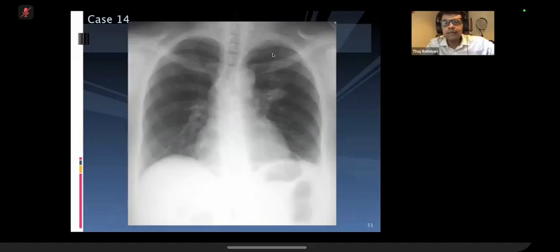So what has happened is that the vascular structures are sparse here in comparison to all the branching blood vessels on the right side. That is because the left upper lobe is abnormal. So we know that whenever the vascularity reduces, that lung is abnormal. The lung can still have aeration, but the hallmark for an abnormal lung is poor, sparse vascularity. The vascularity in the left lung is reduced, and we have this oblong opacity in the left upper lobe, which is a bit of a tricky diagnosis.